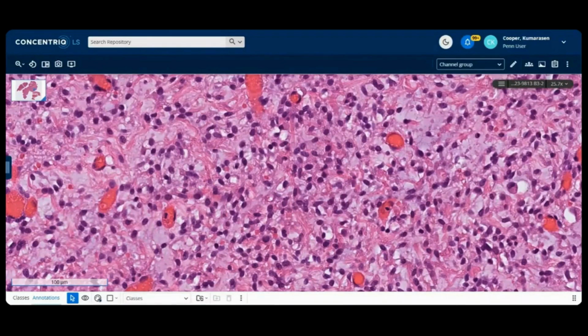Okay, sorry. There was an extraskeletal myxoid chondrosarcoma in the last case as well. I apologize, I did not address that, but I see it's come back up here now again. All right. So Sheena says myxoid liposarcoma, Abdullah extraskeletal myxoid chondrosarcoma, and Omar wants a DDIT3. So DDIT3, as you know, I wish I could remember what DDIT stands for.